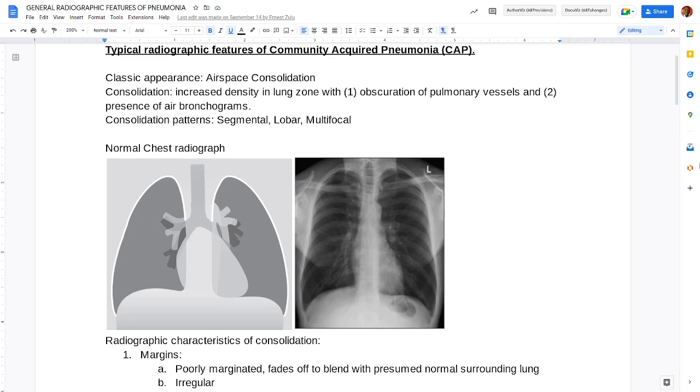Look at that L, which shows the side of the body, which means left. You've seen the marker there, on the image to the right on top, in this corner. When you do analog, you actually use a metal shaped like L, which is superimposed on that image. So metal will look completely white.